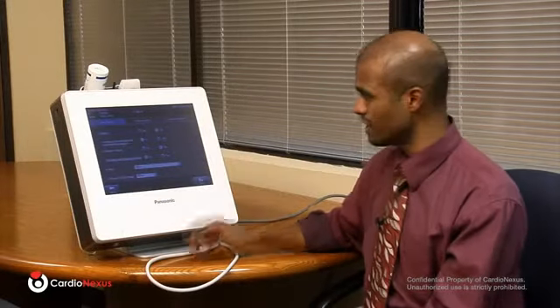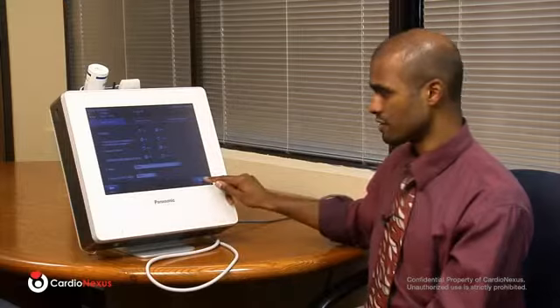Again, you'll notice the asterisk next to each required field. So once you've entered in the risk factors, you can simply press the start button. It will bring you into the main Study Hub page. So this is our main study menu. Each of these applications launches a separate window, allowing you to either manually type in the numbers, or if you were to have a Continua enabled, Continua is basically the medical grade Bluetooth standard. If you had a Continua equipment to measure point of care blood test or blood pressure, that information would automatically sync with the CardioHealth station.